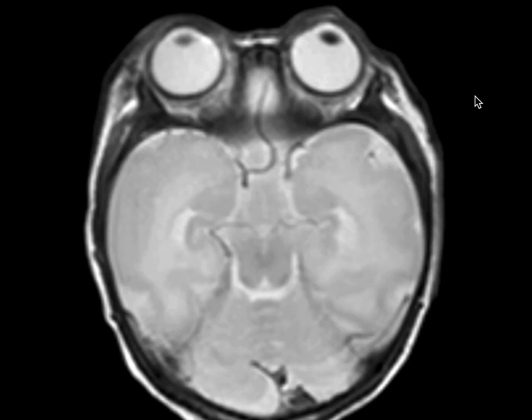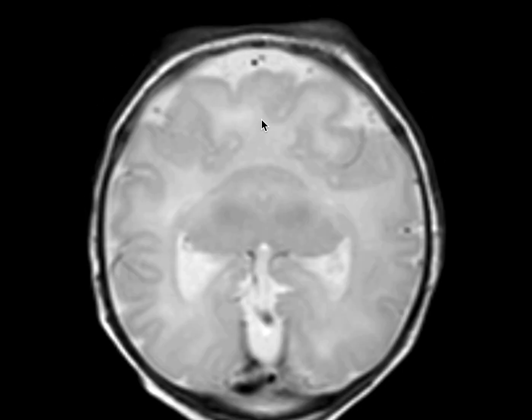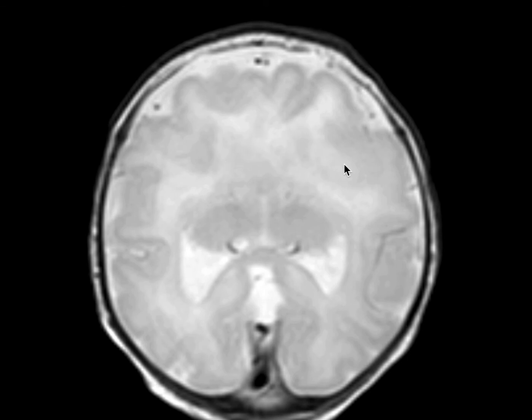We're now viewing a T2 weighted MRI of a patient who was found to have an azygos anterior cerebral artery, seen here. This is a relatively rare anatomic variant, seen in between 0.2 and 4.0% of patients, and it is often associated with neuronal migration abnormalities. As we scroll superiorly here, we'll notice the anterior falx is not developed, and there is greater than 50% fusion of the frontal lobes. We also notice the lateral ventricles are not developed anteriorly, and only a small amount of corpus callosum is present. These are characteristic features for semilobar holoprosencephaly.